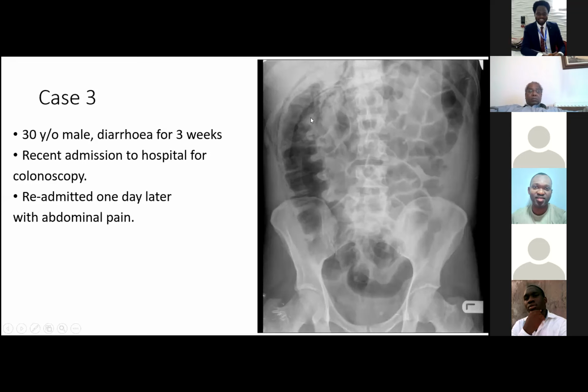So certainly abdominal X-rays in the setting of colitis are useful in terms of tracking the progress, especially in the acute phase where patients are having diarrhea, especially if there's a concern, for example, for either toxic megacolon or bowel perforation. In this case, this was quite useful in someone who's obviously had a colonoscopy. Okay.